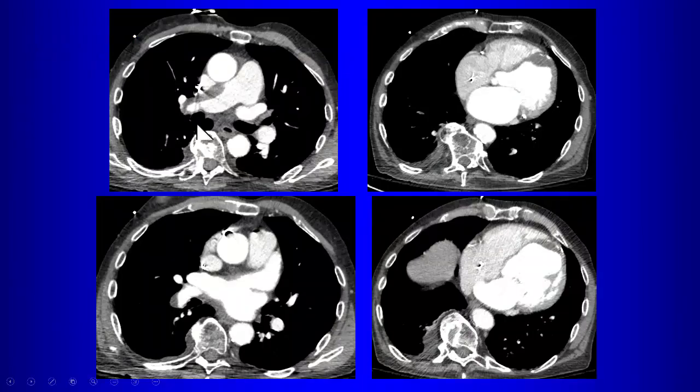More examples of chronic PE. Sometimes this can be subtle. You can blow by it pretty easily on your axial images, right? So this over here is an eccentric filling defect in the right pulmonary artery. Here it is extending into the interlobar branch. By the way, there's another finding here. Does anybody see what it is? Well, I haven't shown you enough images to make that diagnosis. What's the other finding?